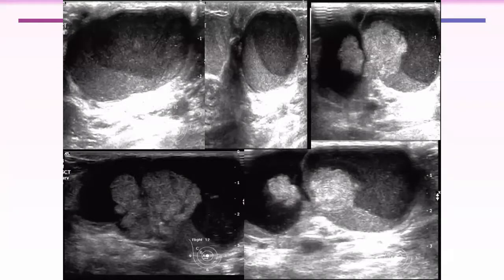I mean, there is a basal soft tissue component of the cystic area in the left lower. When you have a cystic area and you have a soft tissue component, you call it a complex cyst. Yeah, so you have a large complex mass.